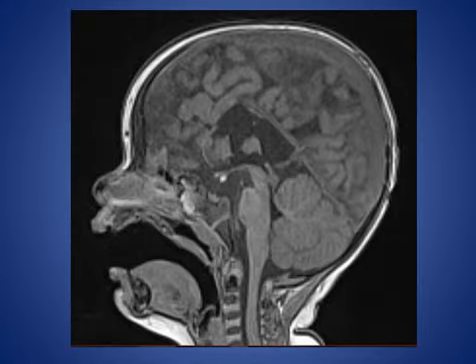Next case, here is a sagittal MRI image of the patient. This is the spot diagnosis. There is agenesis of the corpus callosum, and no corpus callosum is seen in the midline image. Also we see another anomaly: there is a bright spot, and this is an ectopic bright spot of the posterior pituitary gland. It should be here, and it is in an ectopic position.